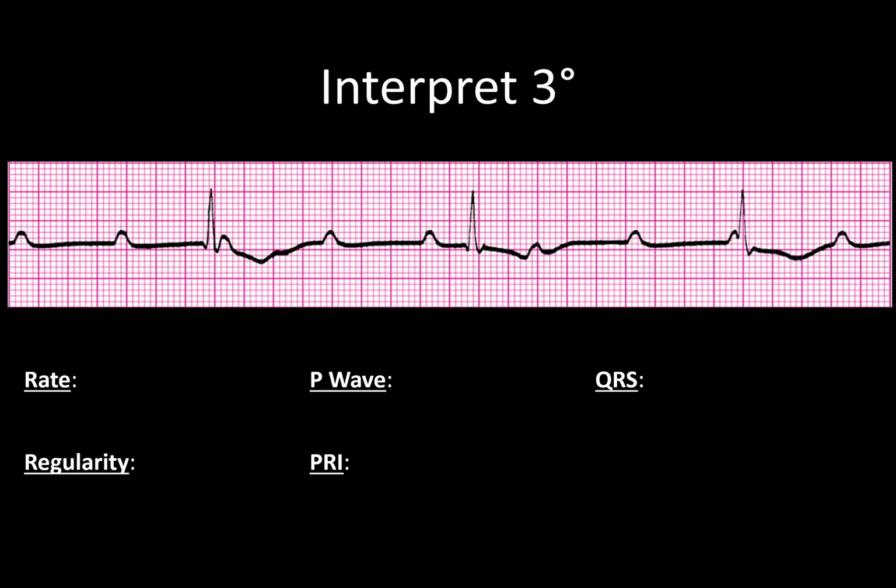One more time. We've got one. This is a 6-second strip. I can promise you that. I'm not going to talk as much during this one because you're just going to watch me fill this out the same way I've done dozens of times already.